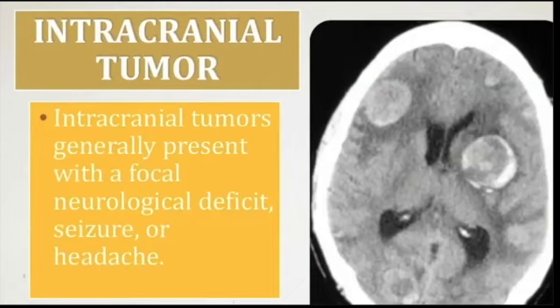Now, an important thing to keep in mind, please, whenever you're looking at a brain tumor, is to remember that brain tumors will be surrounded by a vasogenic cerebral edema. And as we said, a vasogenic cerebral edema is just a cerebral edema in which the blood-brain barrier is disrupted. You can see here the darkness that's surrounding the tumor. So if you're looking at an image and you want to be sure that you're looking at a tumor, it's fairly easy to identify, but also add an extra layer of confirmation by looking for the vasogenic cerebral edema. Okay.